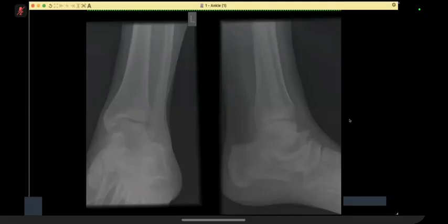The talar dome, while smooth, I can see that the margin between the talus and the distal tibia and fibula is uneven, raising a suspicion of a potential dislocation. I cannot see any lytic lesions in the distal tibia or fibula. The partially visualized distal metatarsals look unremarkable.